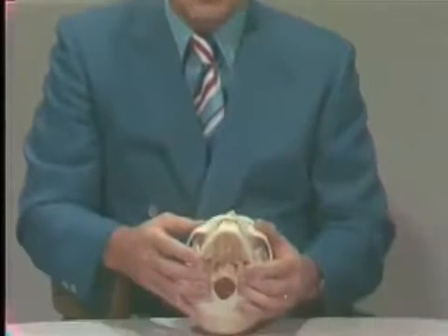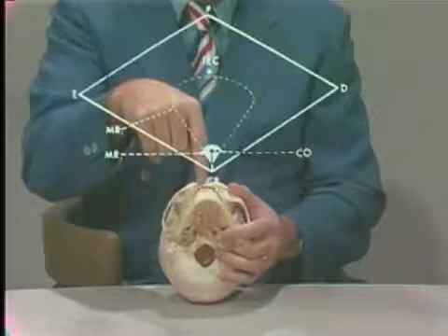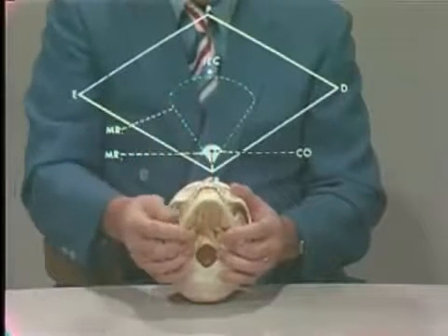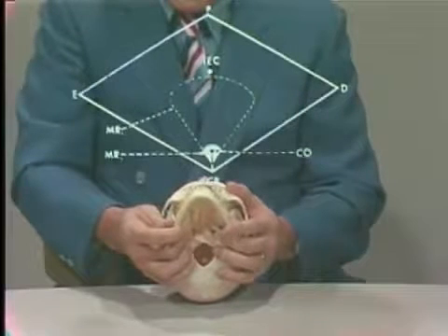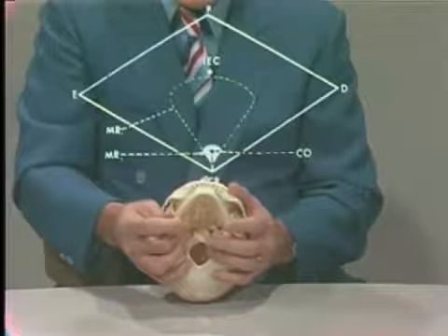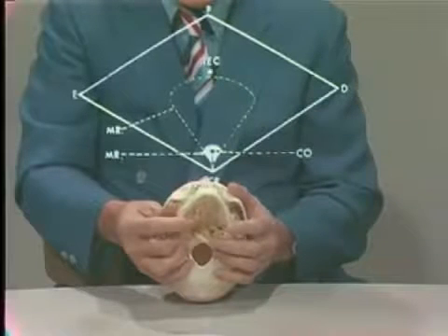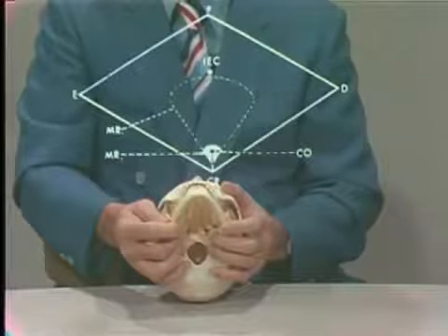Okay, we're going to move from the sagittal plane now to the horizontal plane, and we're going to try and superimpose this drawing. This is demonstrated as if a stylus were attached right to the midpoint, and the movements we'd go through. So we would start now, and if we follow the drawing and the movement of the mandible, we'd go out to the lateral movements, protrusive, opposite lateral, and back in. Now let's do that again. Lateral, protrusive, opposite lateral, and back in. These are the movements in the horizontal plane.